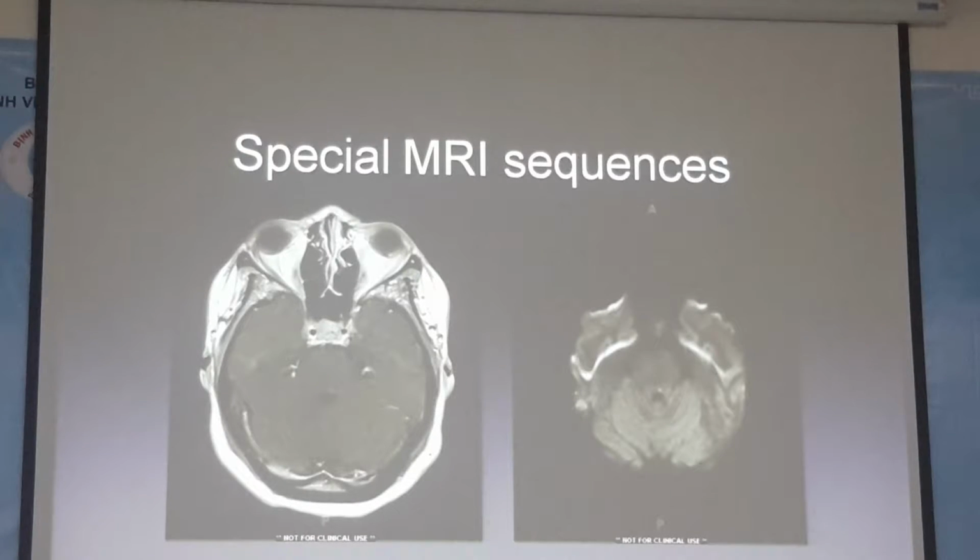And so this is just an example here of a patient who presented to our hospital with acute onset of diplopia. And when the images were originally evaluated with T1 with gadolinium contrast, there was no abnormality that was originally detected. The radiologist said it looked just like a normal scan.